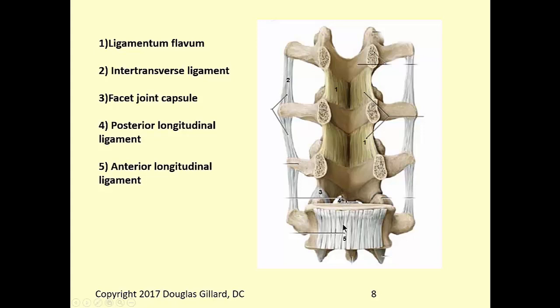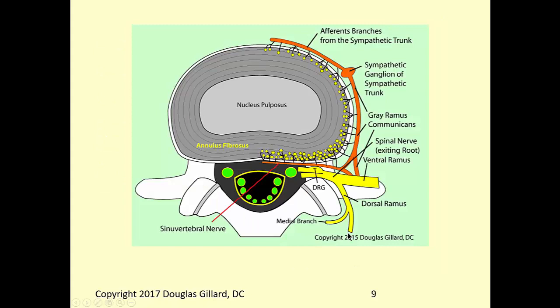That is akin to number 5. Can't see it very good. That's the posterior longitudinal ligament. It's much thinner. Look how broad. This is the anterior longitudinal ligament. So, important key ligaments there.